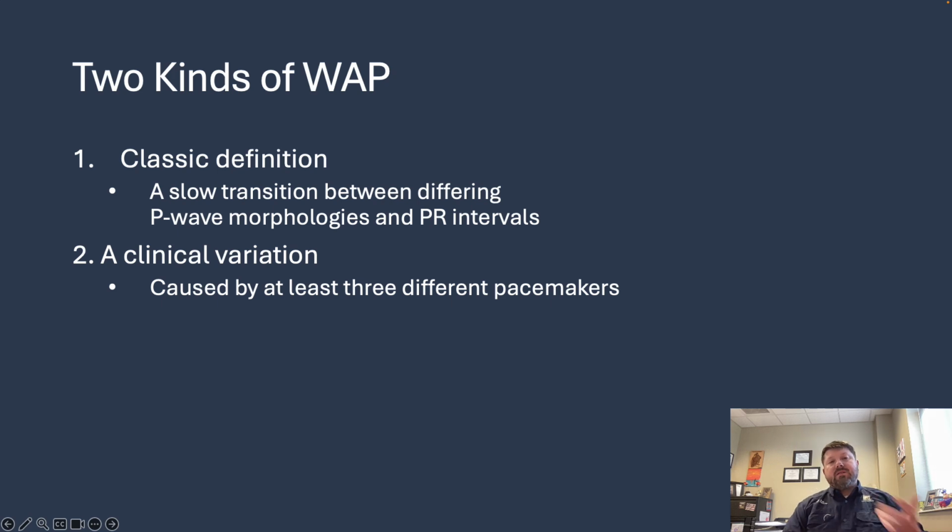So for the purpose of this lecture, we're going to mainly be discussing the clinical variation, because one of the hallmark signs of a wandering atrial pacemaker is that you've got to have at least 3 different P waves that are different in size or shape or morphology on a 6-second strip.